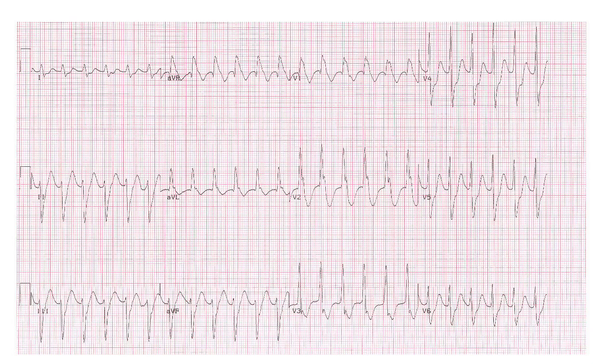And then my next question, is the QRS complex prolonged or is it normal? So I'm going to try and find a QRS complex that appears the widest that I'm going to be able to see. And I would say maybe lead 2. If I were to mark the beginning of my QRS complex here, and my J point is about right here, this is bigger than 3 small boxes. It's almost 5 small boxes. So this is a prolonged QRS complex.